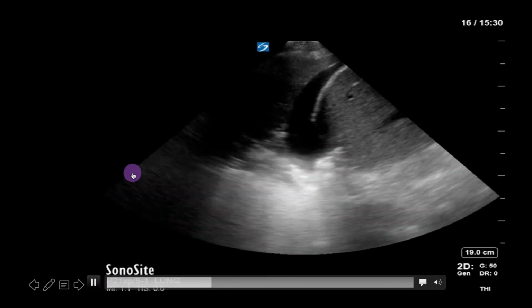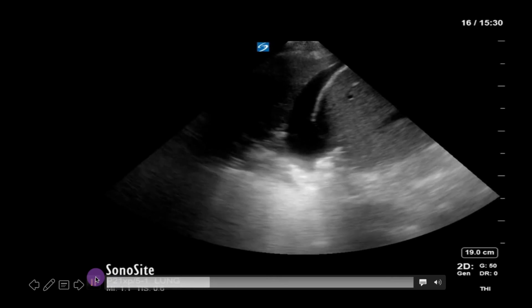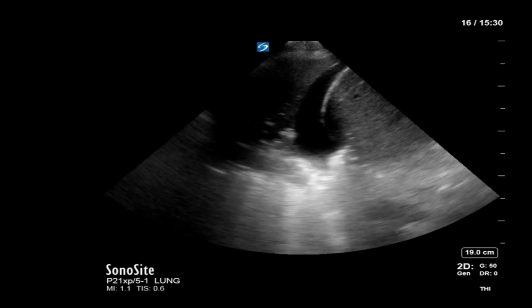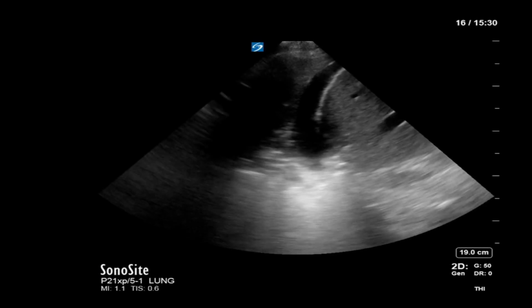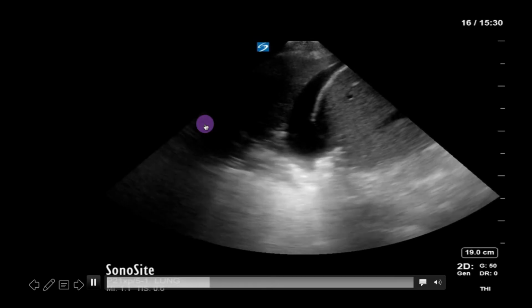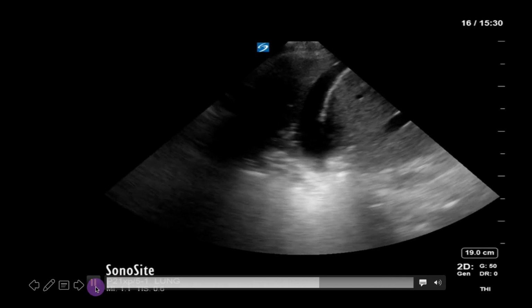Some degree of atelectasis is expected whenever there is a pleural effusion. If the effusion is roughly larger than the consolidated lung, this generally represents passive atelectasis due to the effusion itself. Otherwise, there is either more atelectasis than is expected for the size of the effusion, which may be due to recumbency, mucus plugging, etc., or there is a coexisting cause of lung consolidation, such as pneumonia.